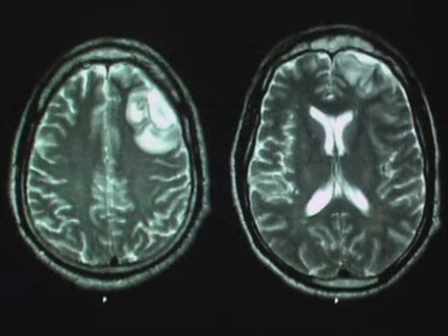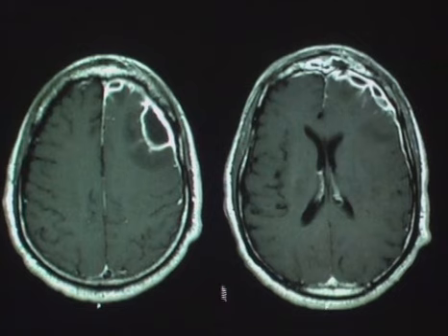So in this case, T2 weighted imaging demonstrates extraaxial collections with a convexity not too dissimilar from what we would expect from something like an epidural hematoma. In addition, there's associated parenchymal signal abnormality involving the anterior frontal lobe on the left. And what we see, which becomes more conspicuous on the post-contrast imaging, is that there's a number of rim-enhancing collections seen in the extraaxial space, in addition to abnormal faint enhancement of the parenchyma.